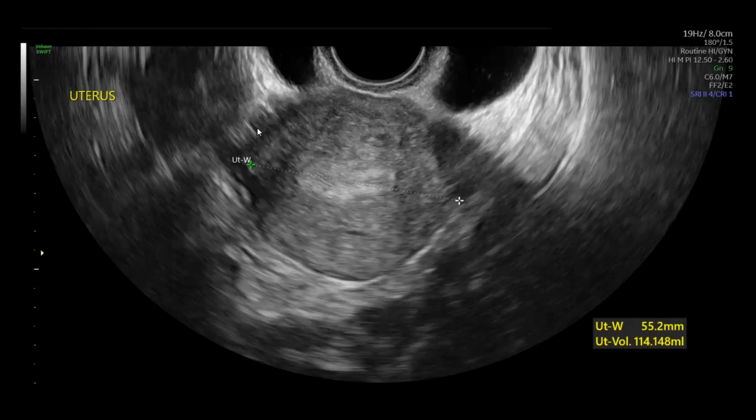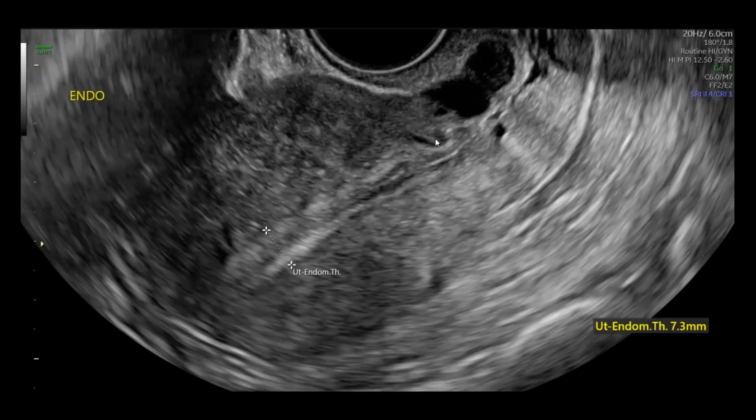So our uterus has a volume of 114 mils, and that's pretty normal. Like we said a few slides ago, the uterus is not quite globular. There's a bit of a hypertrophy happening in the anterior myometrium, but it's not really globular in that light bulb-like depiction. We have a normal endometrium here, anterior endometrium, posterior endometrium. There's a midline echo all the way through. When we were scanning through, nothing was jumping out at me in terms of intracavitary pathology, and nothing has been captured either intentionally by our sonographer to depict that.